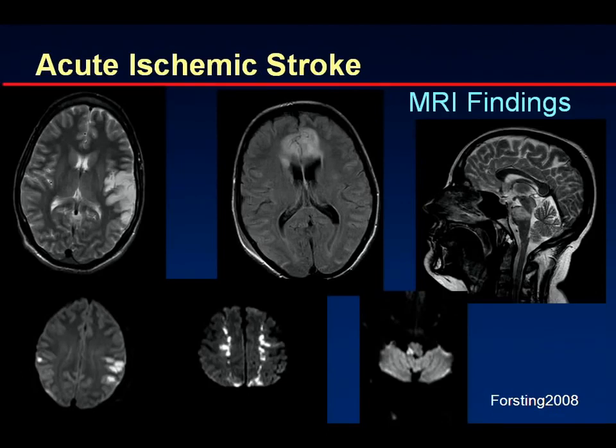These are two images from the same patient, and what you do see is small cortical infarcts on a diffusion-weighted image and a few deep white matter infarcts, relatively peripheral. Now, if you look at this distribution, what should come into your mind is that this is very likely an embolic source that shoots small emboli into the brain.